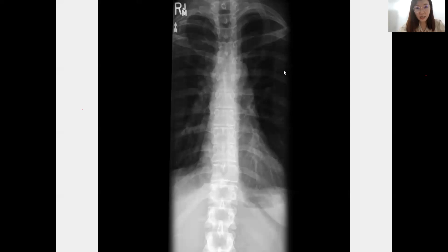Okay, so this X-ray is finishing soon, but just to highlight, whenever we review the chest X-ray and also the abdomen, we will always look at the spine, right? So now target on the spine and see if you can find anything. Oh, there's a fracture.